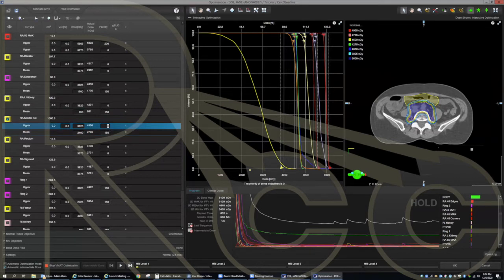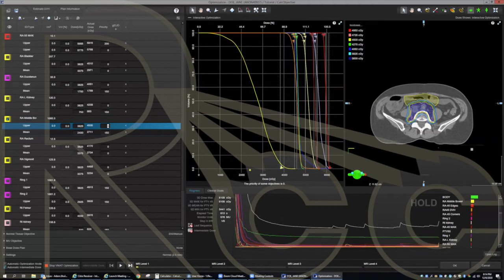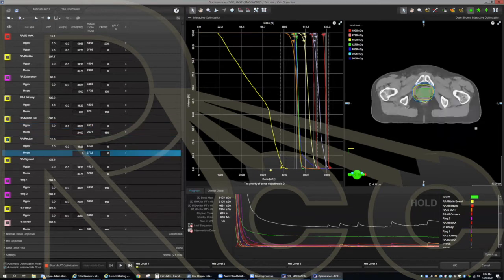See how this goes. I optimize one organ at a time. That way I can hit a local minima for each organ and let the PTV go back to where it was. And I can also tell which is affecting the PTV. So if I optimize 4 different organs at the same time, my PTV drops. Well, I don't know which one I changed, which affected it the most. So here you can see I hit 24, but it's only at 26.5. Means I probably can't push it much more right now. The other ones were getting much closer. So I'll move to something else temporarily. Let's try the rectum. Move this to 24.